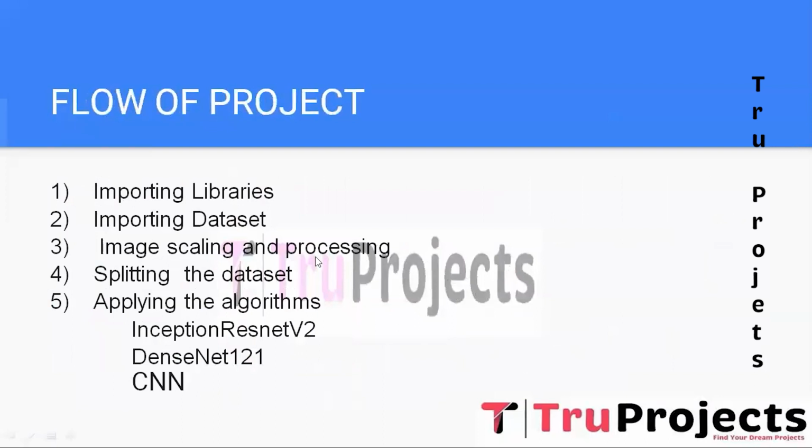And to know about the flow of the project, these are the steps we need to discuss. The first one is importing the libraries. In this step, the necessary Python libraries and frameworks for deep learning and image processing are imported. Commonly used libraries like TensorFlow, Keras, NumPy and others will be included to facilitate model training and image manipulation.